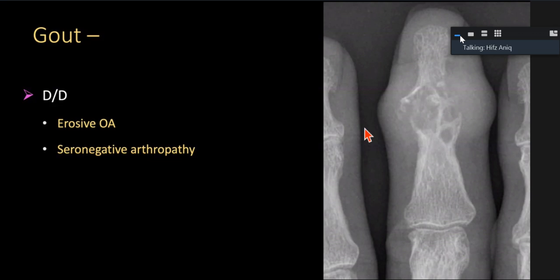Other arthritis can give this appearance, but we don't see that appearance here. This appearance usually collapses centrally. There are no overhanging erosions, and it is usually not associated with swelling, which is asymmetrical. Seronegative arthritis can be, but it doesn't give this type of overhanging erosion, and the margins of the bones are fuzzy. We have a very sharp margin, so that can be ruled out. You have to magnify it or use a magnifying glass.